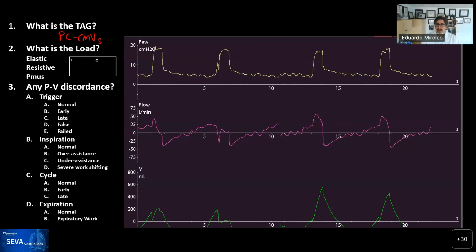All righty, so here, a little bit of both. Let's take a look at the waveform. Remember, because you're controlling pressure, if it is a passive breath, you would expect during inspiration to see a peak and then an exponential decay. And when the patient exhales, if it's passive, you expect to see a peak and then an exponential decay. That's what you would expect in a beautiful, nice, passive environment.